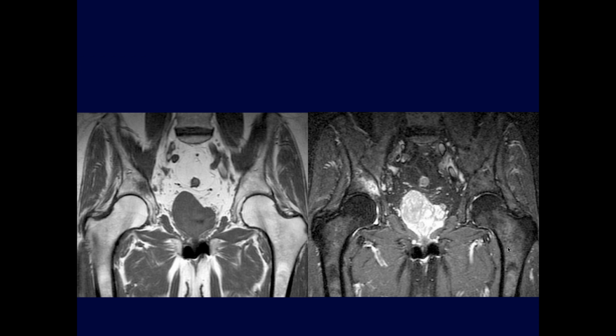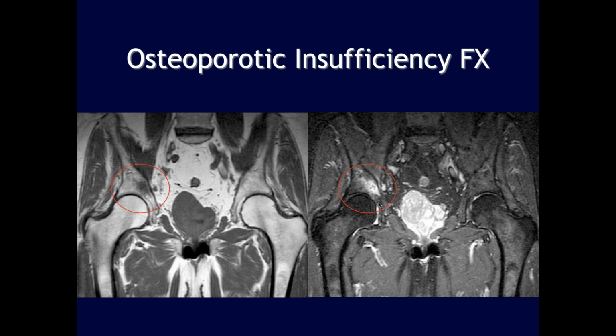Michael, what do you think of this one? Right hip pain. So we see edema on the stir images up in the kind of central acetabulum. The femur itself looks okay. The T1 weighted images is just kind of indistinct blob. I don't see a definite fracture line extending into the cortex. And do they have any other history, like trauma or insufficiency fracture of acetabulum? Their hips just started hurting. Yeah, so I'd worry about a trabecular bone injury, and this is from insufficiency fracture.